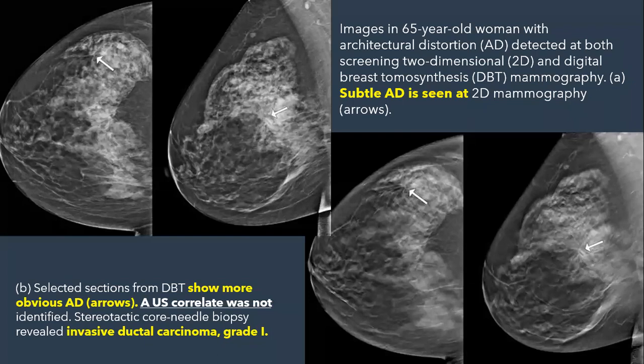How many are we missing from the 2D mammography? Medina? We miss a lot, yeah? Yes. If this is an invasive breast cancer, definitely in this complex parenchyma, we have a lot of missing. Do you agree? Yes, totally agree.